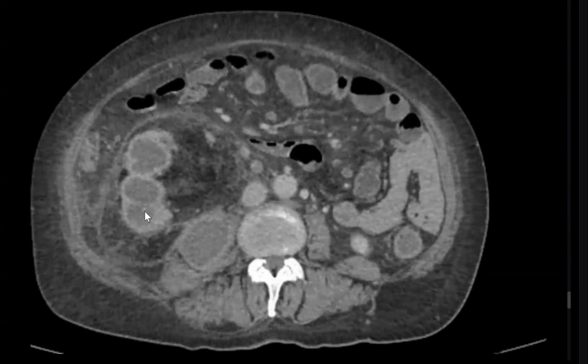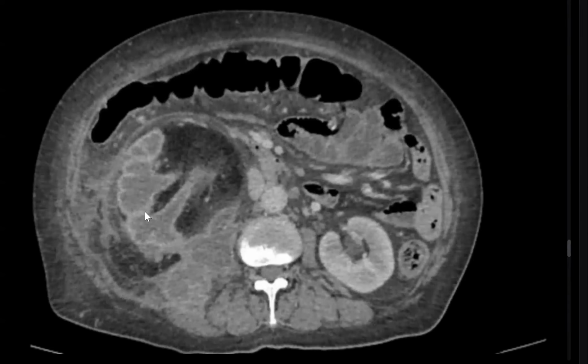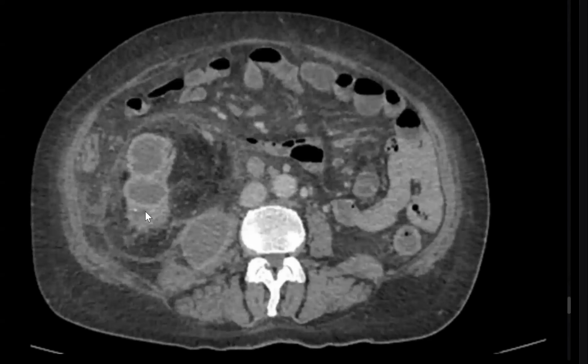The right renal parenchyma is seen having a well-defined collection, and also there is replacement of the parenchyma with fat attenuation, I think, with a pelvicalyceal branching stone, consistent with staghorn stone. On top, there is right xanthogranulomatous pyelonephritis with the surrounding fat stranding. Very good, my friend.